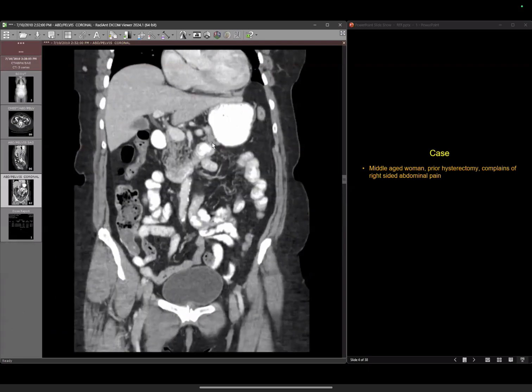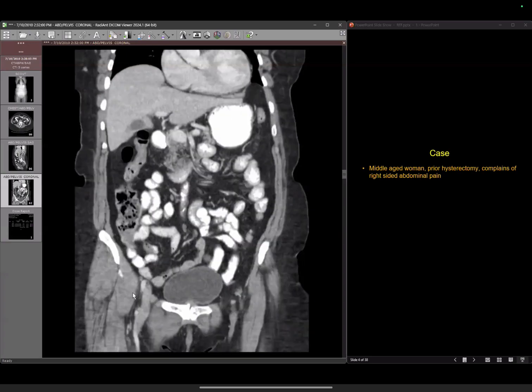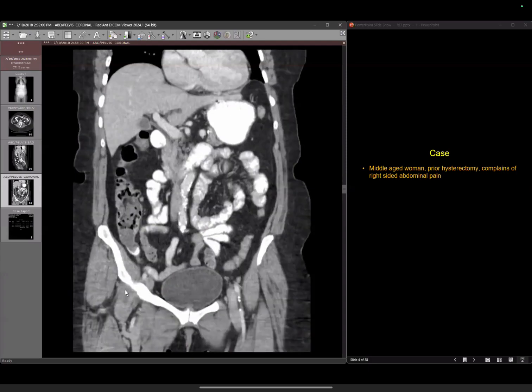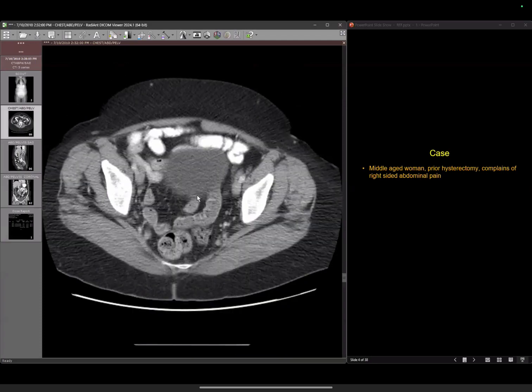Sir, appendicitis usually involves children or adolescents. If we see a dilated appendix with hypodense internal contents in a middle-aged or old person, we have to suspect something; it's not simple appendicitis. And there would be peripheral fat stranding in appendicitis, which is not there, right? So there is no appendicitis.